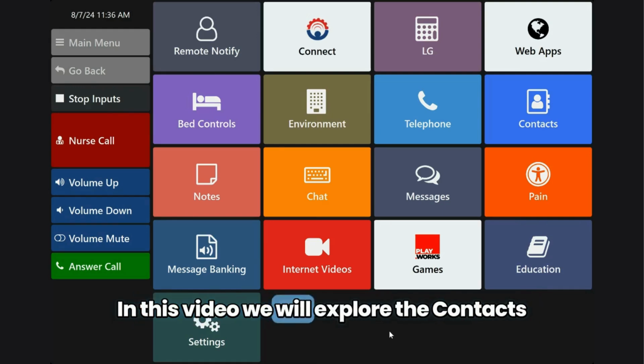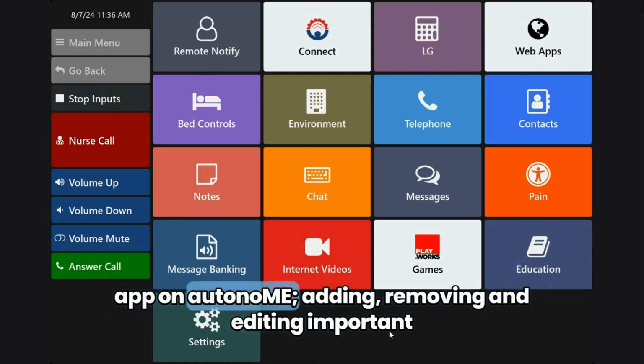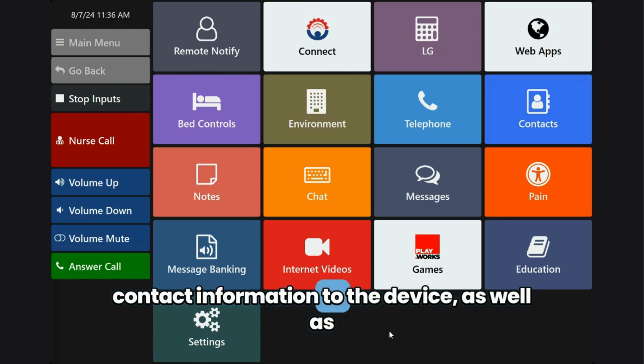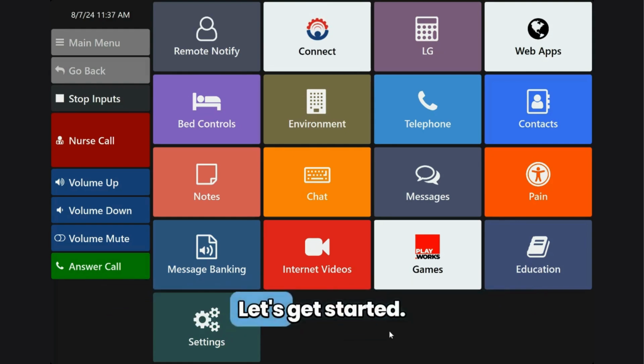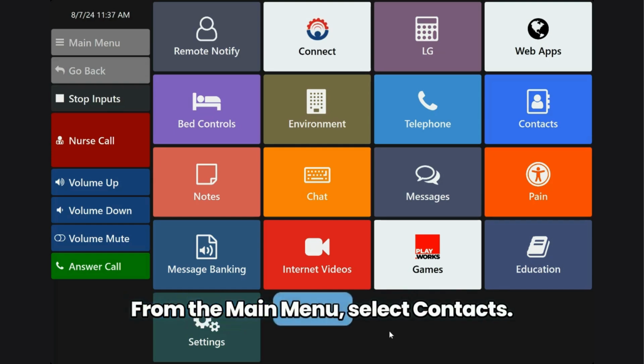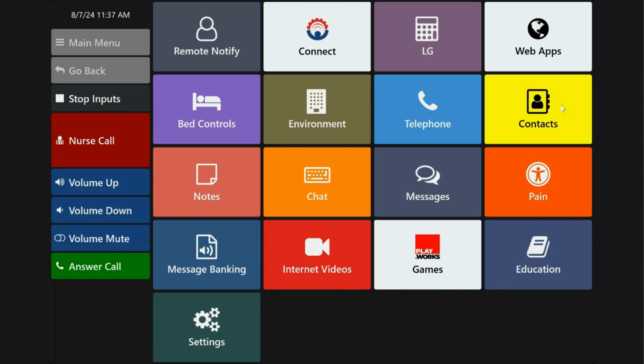In this video, we will explore the Contacts app on autonoME, adding, removing, and editing important contact information to the device, as well as placing calls from the autonoME. Let's get started. From the main menu, select Contacts.